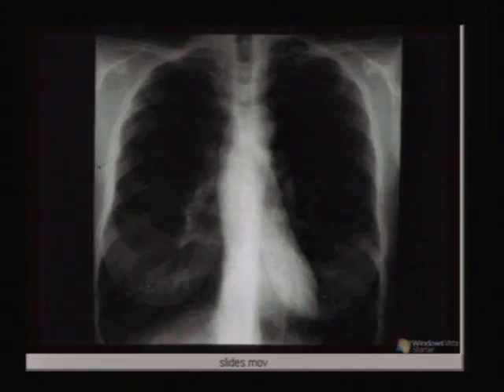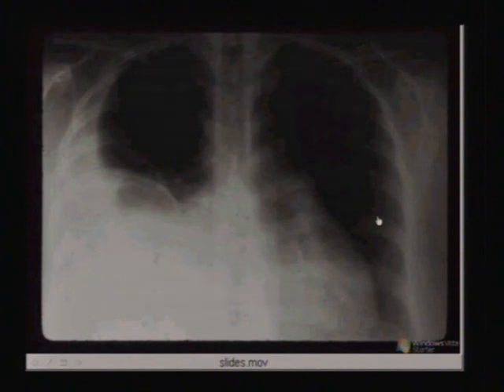So this is a picture. I think it is a little difficult to appreciate cysts in this. Here you can see in this we can see multiple cyst-like opacities on both the lung zones. The same patient later on presented with evidence of pleural effusion. So on the basis of X-ray chest, you can make some differential diagnosis.